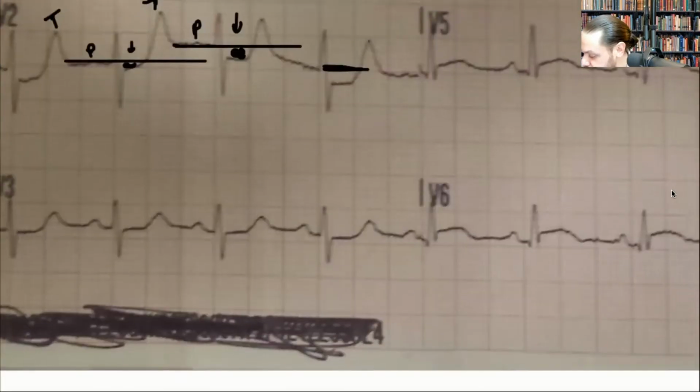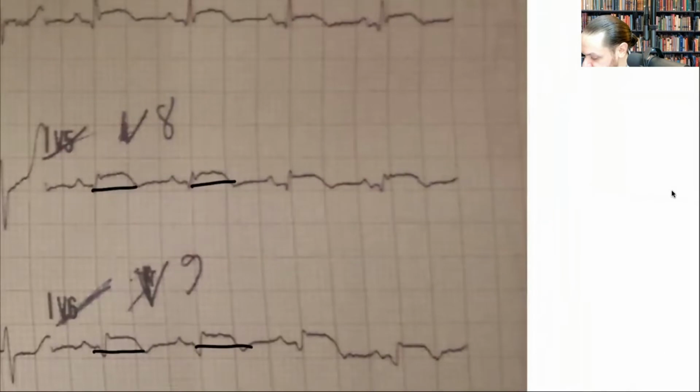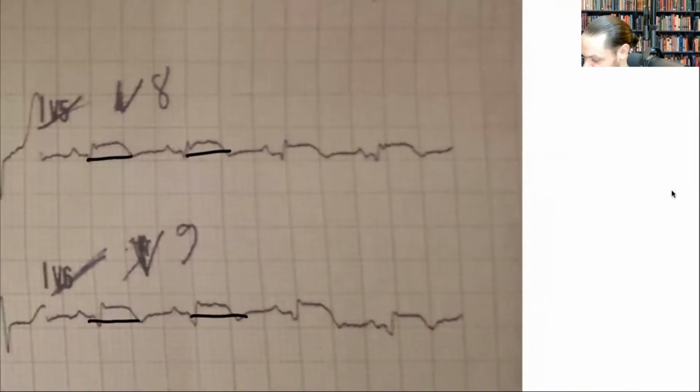But if I look here, right, let me come to the elevated side. So I know this is from the previous, this is my P wave, this is my T wave, so my isoelectric line should be here.